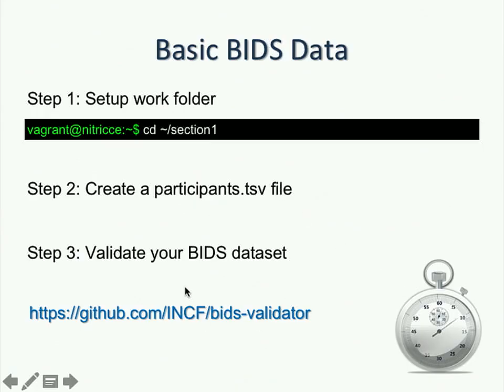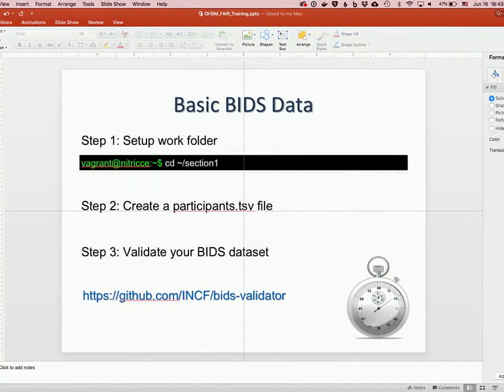And then we have a Firefox browser within our VirtualBox, and I'll show you how you can actually use one of the online validators. What was the other file, the JSON file? The dataset_description.json file. That's why it's handy to have that PDF, because that describes it.